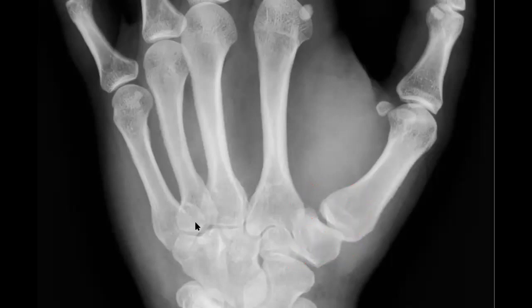So there is a fracture of the metacarpal base. The most important thing is that you check something called the zigzag line. All these bases should be above this line. If you find any base below this line, probably there is dislocation and fracture in the base of the fifth. Thank you.